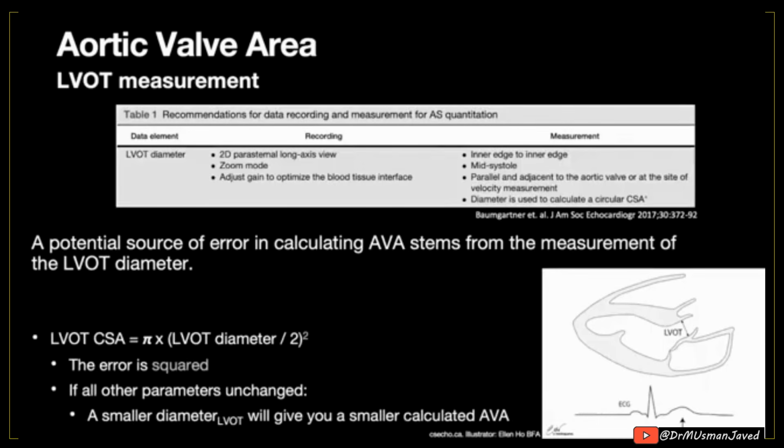Before we do that, I just want to give a little shout out to the LVOT measurement, which punches above its weight, so to say. This is some recommendations from the American Society of Echocardiography on how to measure it. And it's important to do this in a reproducible manner and making sure that your LVOT measurements make sense from study to study when you're comparing studies.